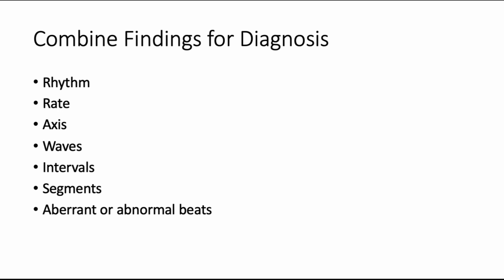I never want you to have an EKG that just pops up on screen and you automatically say, this is the rhythm that it is, or this is the diagnosis, because although it may be obvious, you only see what you're looking for. So if you only look for that initial, oh, I'm guessing what the strip is, then you're going to be in trouble, because you're going to miss maybe those ST segments that are elevated, especially if they're subtle. You may miss a block of one type or another. So we really want you looking through every single portion of that EKG to determine, what is really going on with my patient? Is there an underlying disease? Is this EKG trying to throw me off? And then as you look deeper, you can find really the diagnosis for that patient.